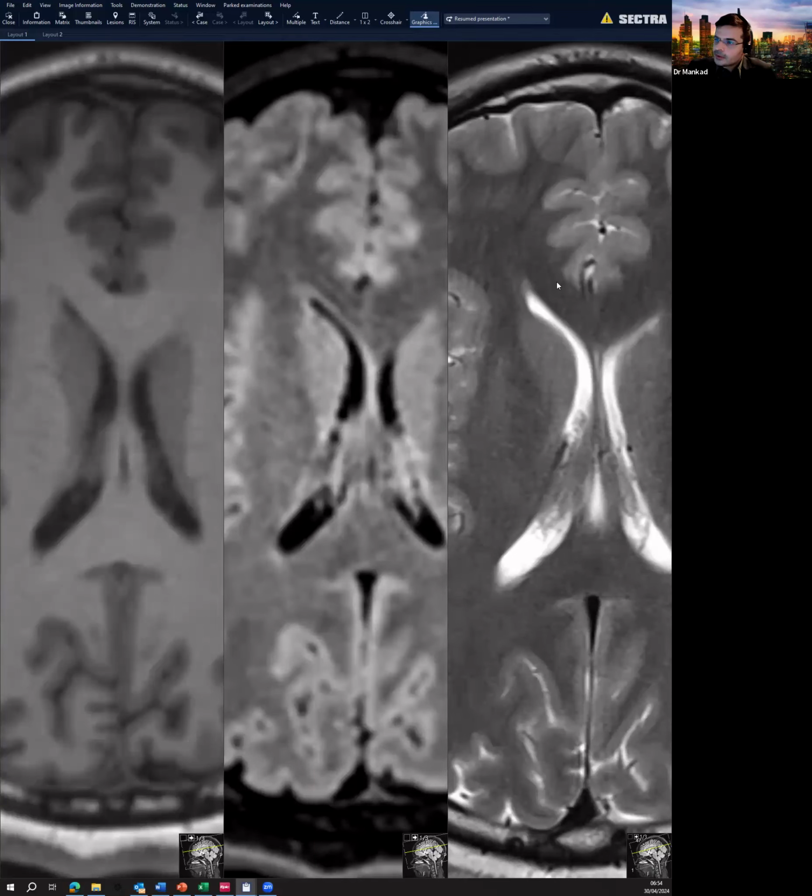All right. So T2, white matter dark, CSF bright. FLAIR, white matter still dark, CSF saturated out completely. This is nulled signal. T1, the white matter is bright. Is that useful for you to remember? Okay. And you might want to even take a screenshot of this to be able to remind yourself of what is T1, FLAIR, and axial T2.